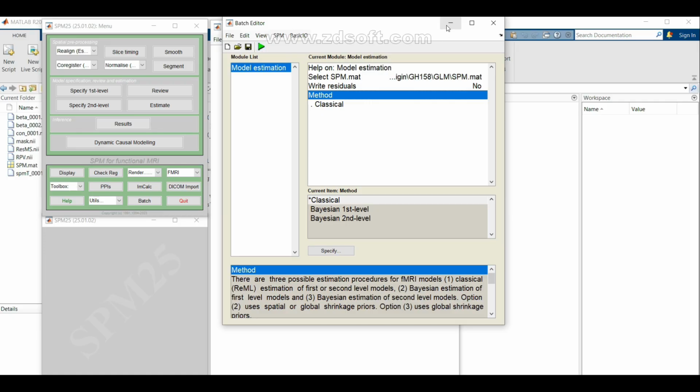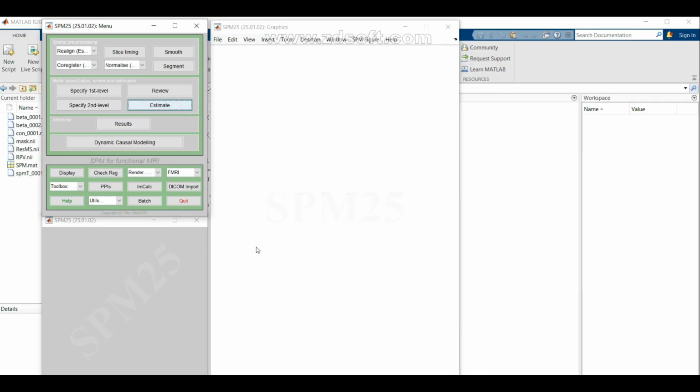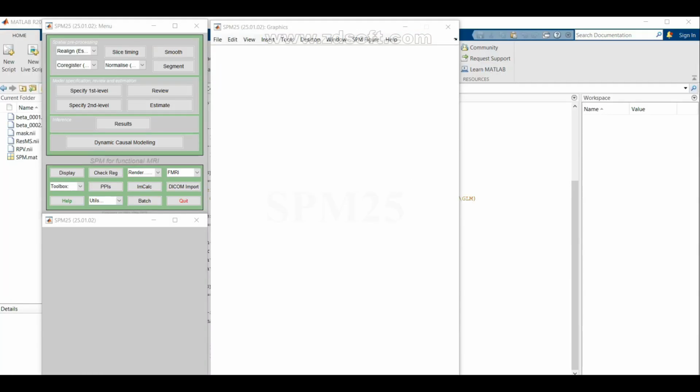And after running this file, we can see the result. Let me find here. Click on results.